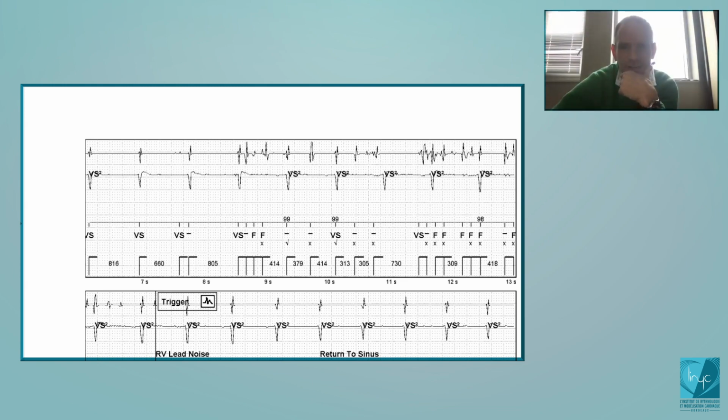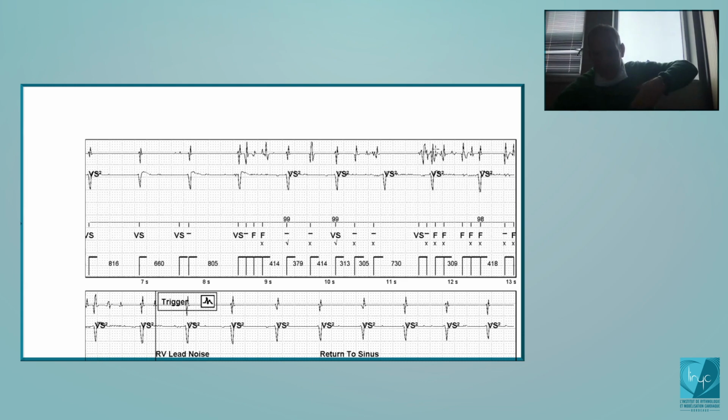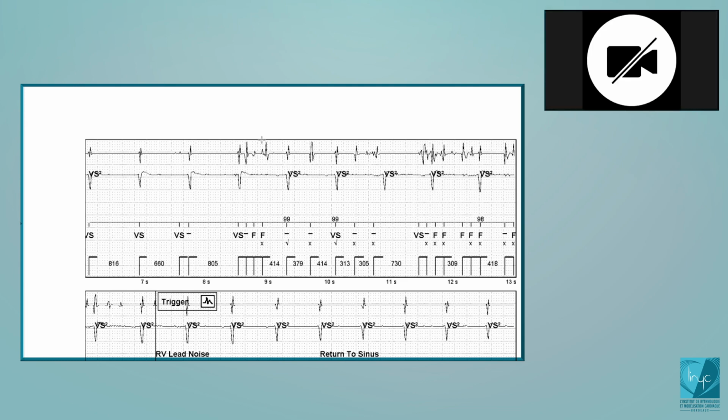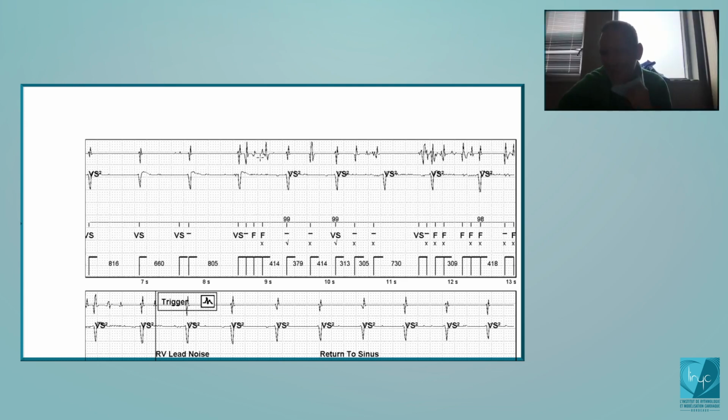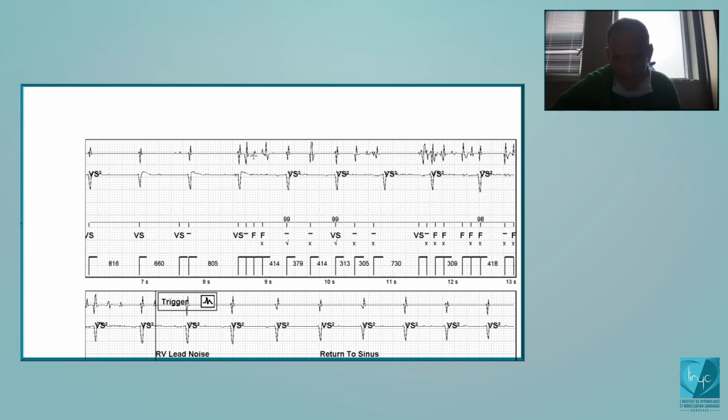Here you see very fast polymorphic signals. It really looks like that could be also the scalpel. You see, electrical scalpel. I don't know the word in English, but it will be also present here. Okay, so that's not the case. So that's clearly in favor of a lead dysfunction here. Okay, probably that's the case in this patient. But you see, there is false tachycardia in the bipolar channel, and then you will implement the VF counter. You see how it works?